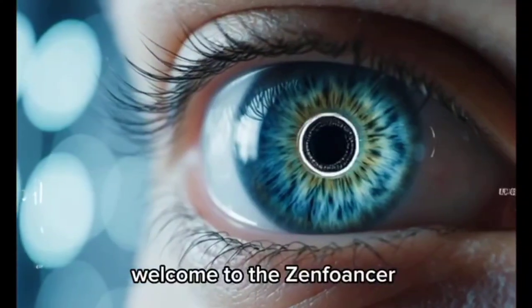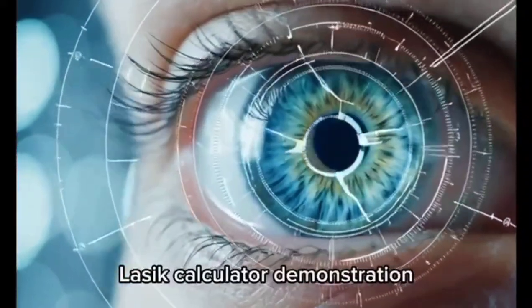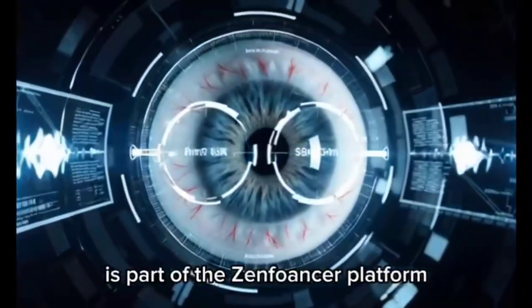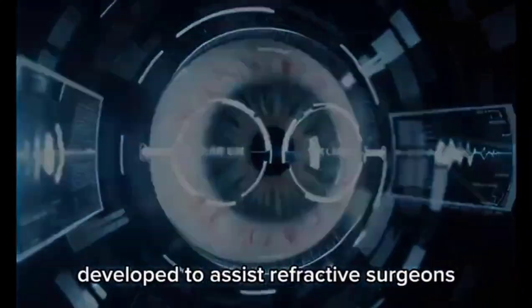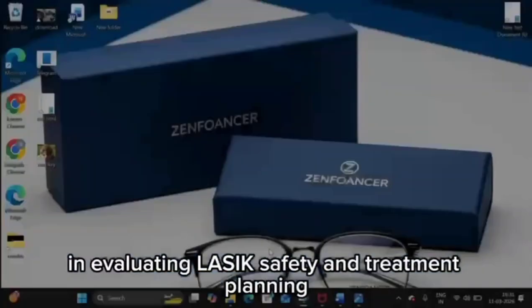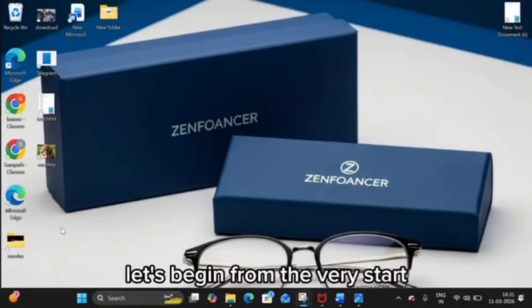Welcome to the Zenfoancer LASIK Calculator demonstration. This intelligent surgical planning tool is part of the Zenfoancer platform, developed to assist refractive surgeons in evaluating LASIK safety and treatment planning. Let's begin from the very start.